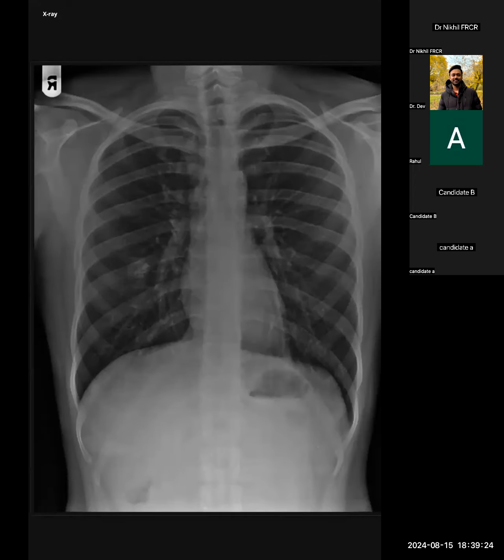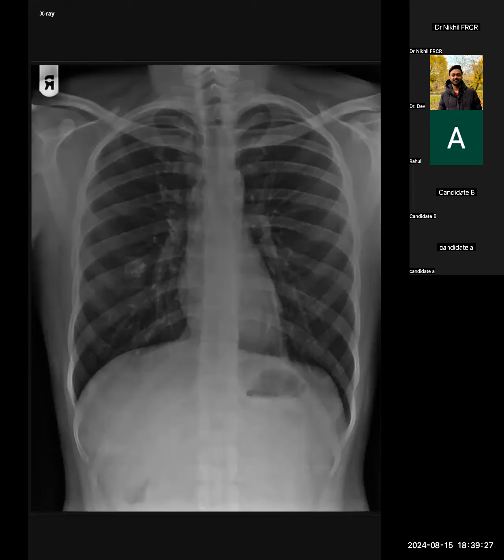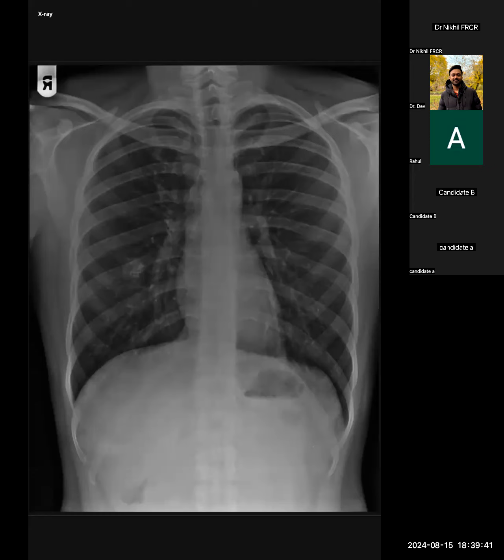Yeah, you can start. So I'm presented with the frontal radiograph of the chest of a skeletally mature patient. I can see that there is a well-defined radio-opacity in the right middle zone and right lower zone. It has some internal heterogeneous calcifications. There is some low density also seen within the lesion, and there is mild surrounding consolidation. The underlying rib appears normal.